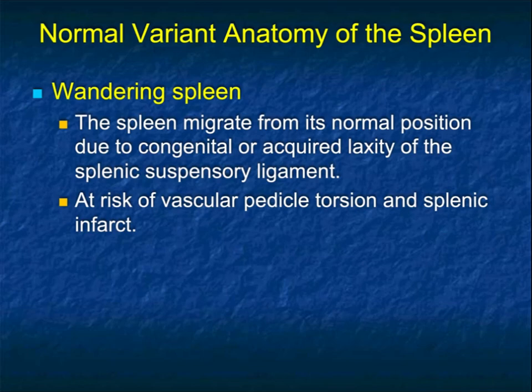So I hope this helps you in thinking about the spleen. I typically show splenic tumors, a splenic infarct, and splenic abscess, looking at differential diagnosis of variable splenic tumors. But here is not tumors, not infection, not infarction, but variations in anatomy and potential pitfalls on a daily basis.